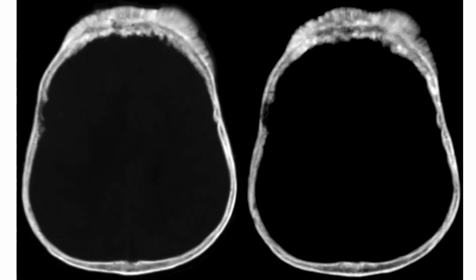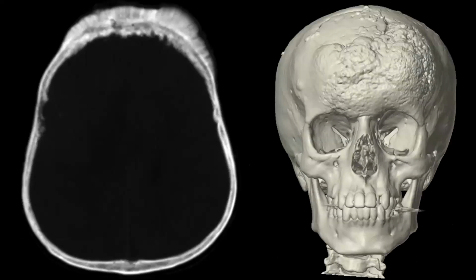Osteosarcoma absolutely can show this. So the question still remains, why do we know it's not sarcoma? All right, and there's the whole thing. I'll tell you, this is hyperostotic meningioma for sure. Have you ever seen it like this, by the way? If you haven't seen hyperostotic meningioma from this perspective, 3D reconstruction of CT, that's why you come attend the MD Anderson Cancer Center Integrative Diagnostic Medicine Case Conference so that you can see things like this.